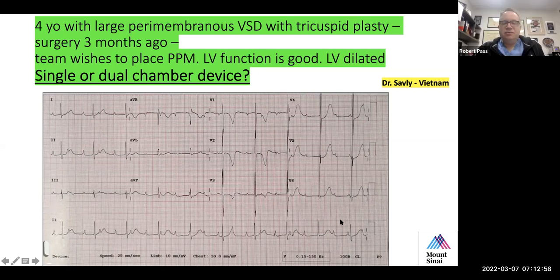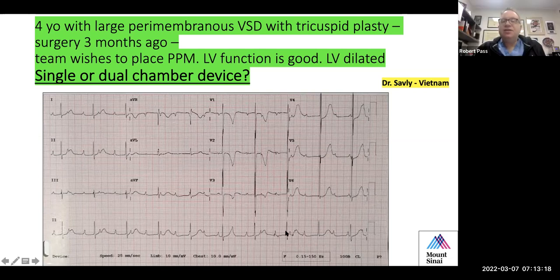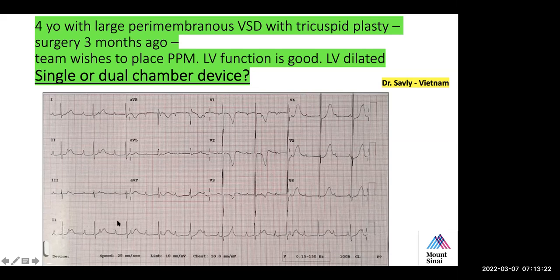So why don't you look at this rhythm strip here? I think it's easier to see what the relationship of the P waves to the QRSs are, or if there is in fact a relationship at all. So the RR interval looks normal, looks constant. So I'll rephrase that to say there doesn't appear to be any RR variability. Yes. Okay, I agree with that statement.